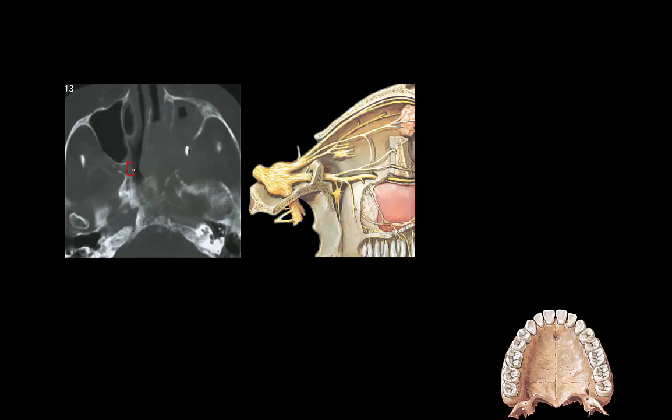So what's the name of the foramen right here between the sphenoid bone and the little bone right here, the palatine bone? That's our sphenopalatine foramen. Then we have a fossa that goes from the pterygoid plates and the palatine bone. So that's the pterygopalatine fossa. And then we have the pterygomaxillary fissure. It almost looks like a vuvuzela or a trumpet, if you will. So we have the foramen, fossa, and fissure: sphenopalatine foramen, pterygopalatine fossa, pterygomaxillary fissure. There you go, right there.